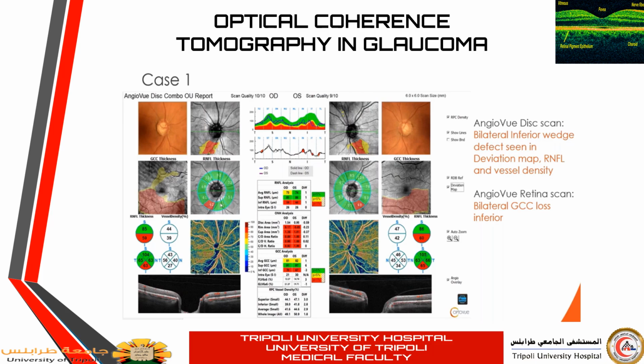In this slide, there is an example of how we incorporate the structural OCT information along with the OCT angio information. This is a patient with a very clear right and left eye optic disc cube along with the macular cube. You can see in the right eye here, there is a decrease in the thickness map, clearly seen in the deviation map, which is marked in red here. Even when you look at the neuroretinal rim, you'll find borderline thickness decrease, especially in the inferior temporal area, which is touching the yellow area here. So it means this is within the 5% probability.